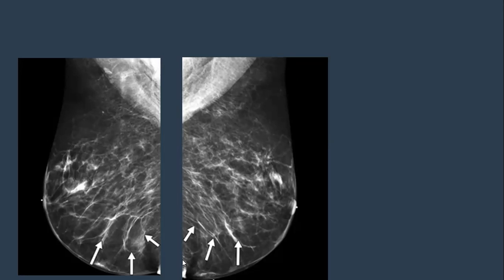The skin thickening with calcification. Thickening without calcification. Okay, focal areas. We can accept some calcification, not clearly seen, but the added density might reflect some calcification. I could not appreciate it well, but it might be there.